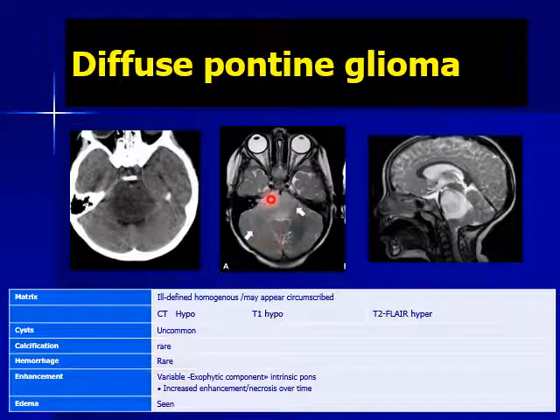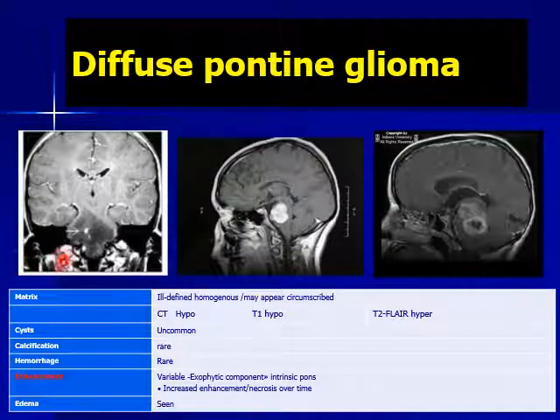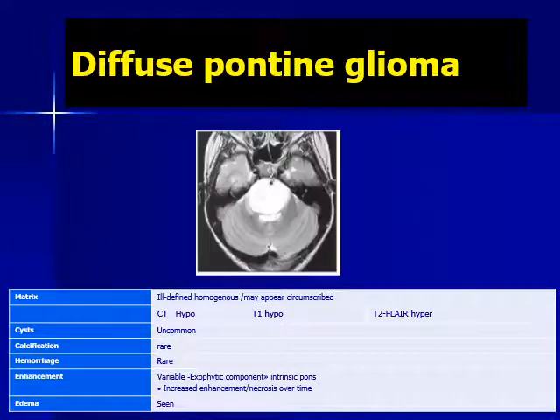But patients with brainstem glioma usually present with gradual onset, long history of disturbed neurological manifestations, especially cranial nerves dysfunction and so on. So clinical is very important. Okay, this is the pattern of enhancement. It can be punctate like this, can be diffusely enhancing, can show necrotic pattern of enhancement as in this case. Again, expansile lesion with engulfment of the basilar.